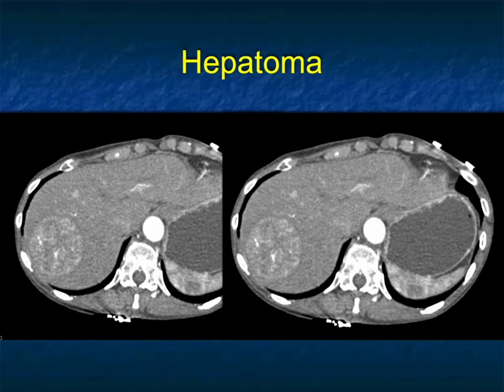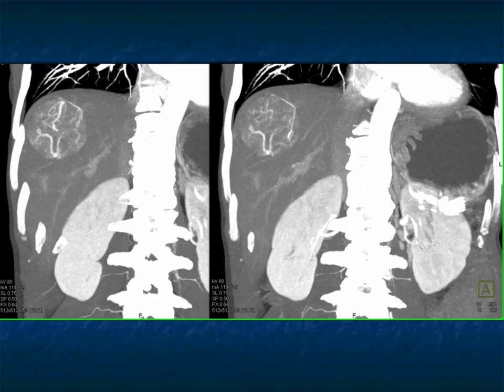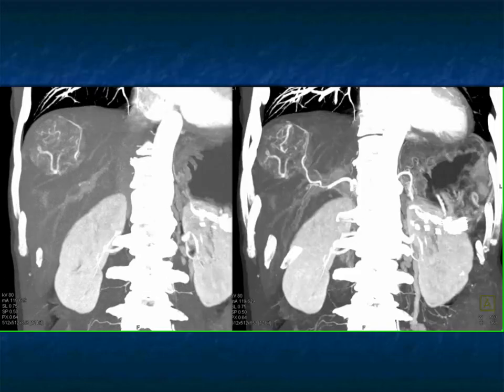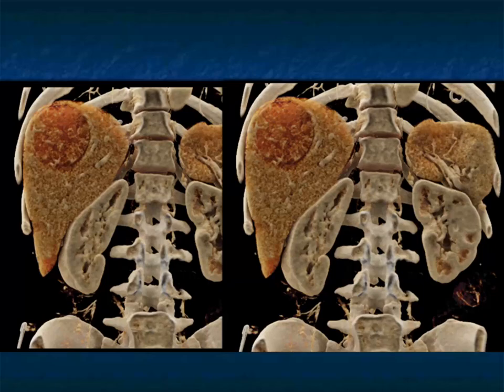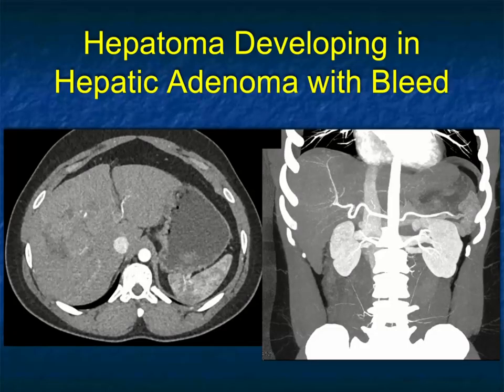Another example, vascular mass, right lobe of liver, lots of neovascularity. It does seem that the more vasculature there is present, the more likely we are to see bleeding, feeding vessels, the neovascularity, all of it very well defined. In this case, I think the fact the lesion is so well defined means it is less likely to bleed over time, but I don't think we ever make that judgment or ever have that conversation. I do like, again, the cinematics showing you the very well-defined capsule of the liver, the relationship of the tumor to the capsule, and the tumor itself being very well defined.